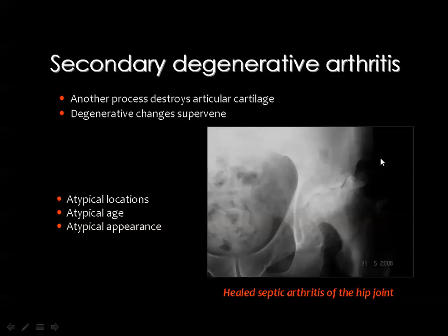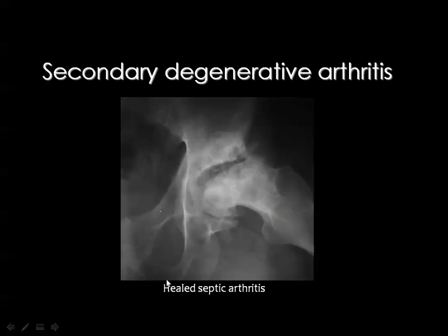As you can see here in the hip, there is total loss of the femoral head, which is almost totally collapsed with irregular surface, and the joint space is severely narrowed. There is bone sclerosis of the iliac and femoral sides, and this is also an example. You feel that there is a previously existing disease here, which is commonly septic arthritis.